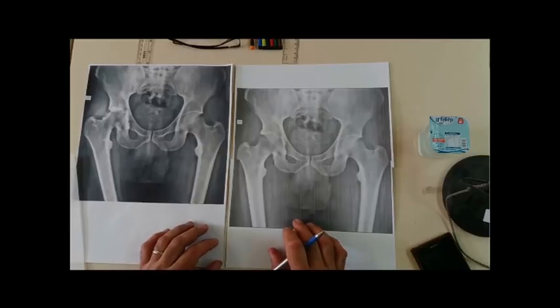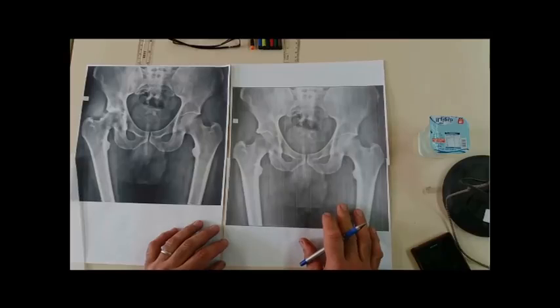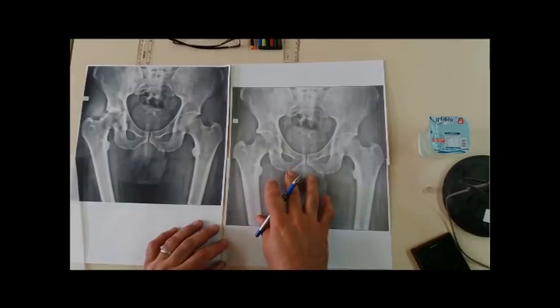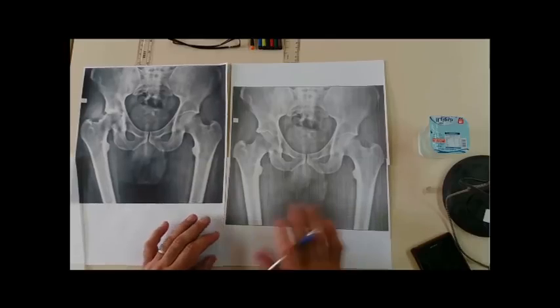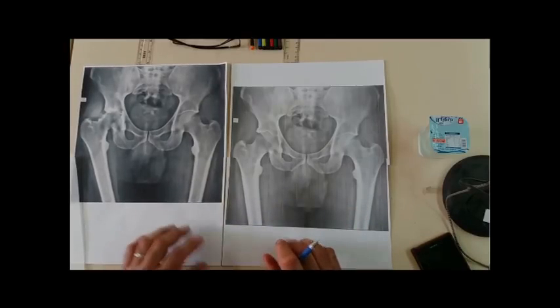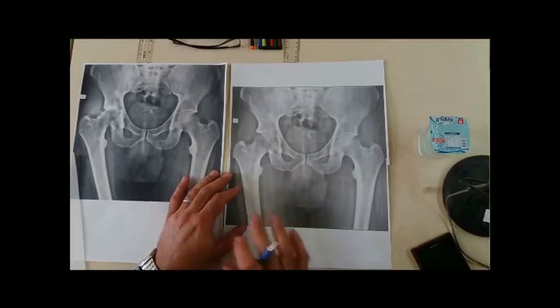The first step is to verify whether the radiograph is adequate or not. If the radiograph is not adequately exposed or has abnormal, unusual magnifications, this will cause errors in the subsequent steps, and the overall templating will not be valid. So the first step is to verify whether this X-ray is adequate for templating or not.